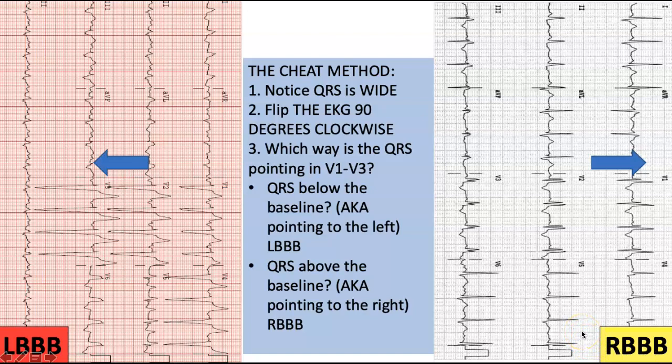And if I check myself here, I can say that in lead V1 and V2, I have an RSR prime, and over in V6, this is okay. If I look in lead 1, this also appears wide here. This appears to be a right bundle branch block.